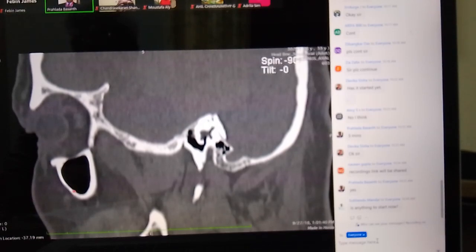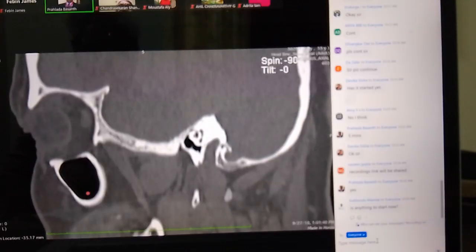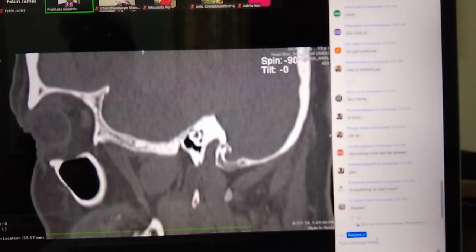And this is the maxillary sinus. Going further, again the frontal bone, this is the orbital plate of the frontal bone, and this is the greater wing of the sphenoid. The temporal bone, the mandible has started appearing. There is a styloid process here. This is the pre-styloid compartment of the infratemporal fossa, and this is the maxillary sinus. The globe has started appearing.